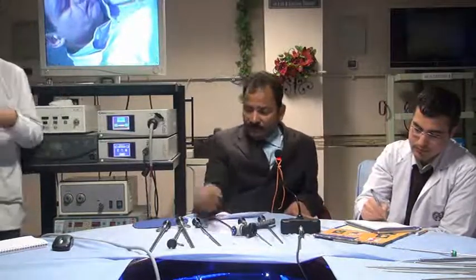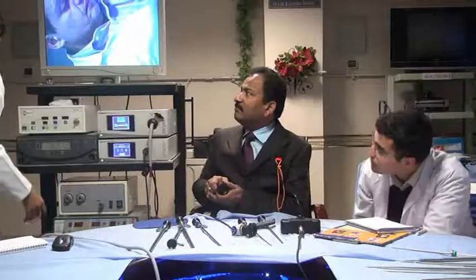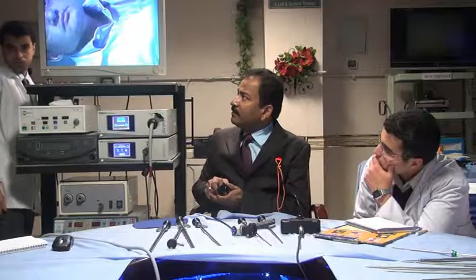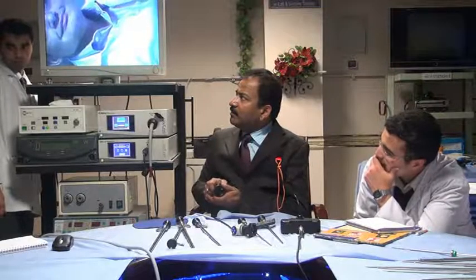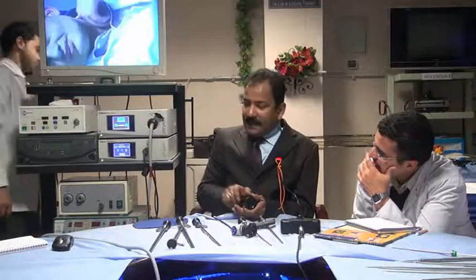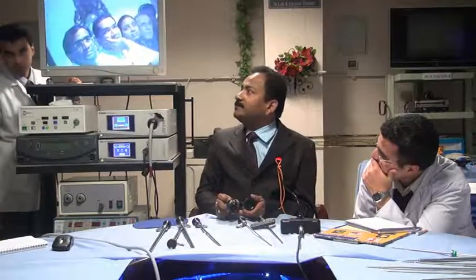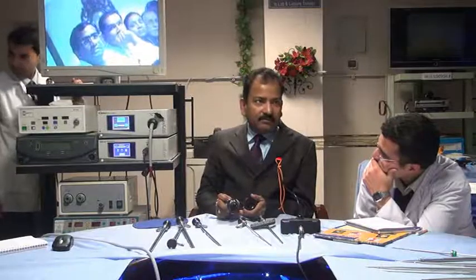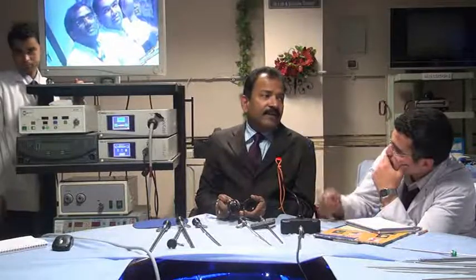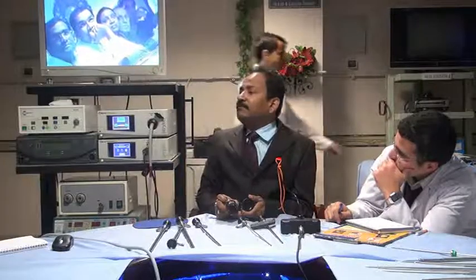I will show you the 3 chip and the single chip. See, this is the single chip. It is not black and white. It is good. And if you see these two, I think that one is better. This is the simple single chip.